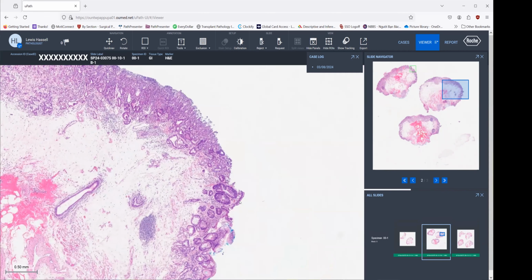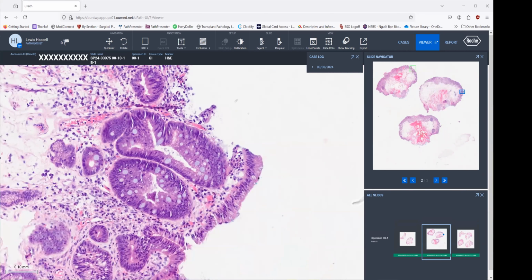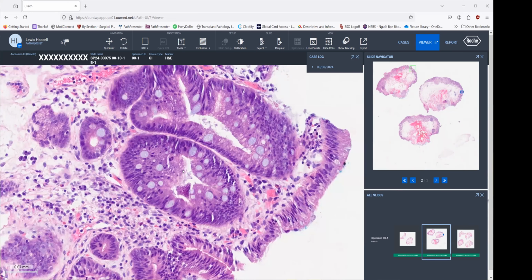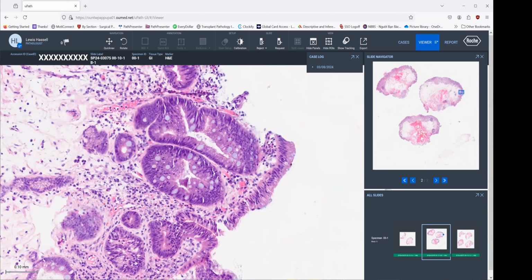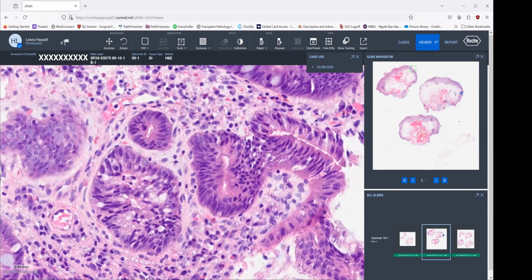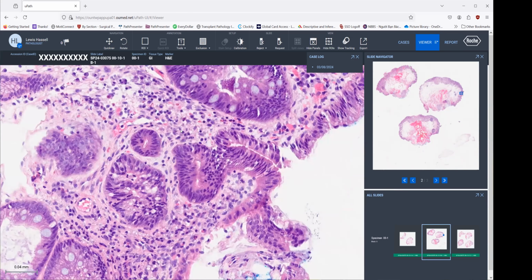So here we have more generic intestinal type dysplasia. It's changed the surface here, and you've got abnormal architecture. You've got some stratification and some nuclear enlargement. This would still be low-grade kind of dysplasia here. Maybe there's a few glands like this where the nuclei are starting to round up a little bit. It's becoming more solid. So this might be turning towards high-grade dysplasia.